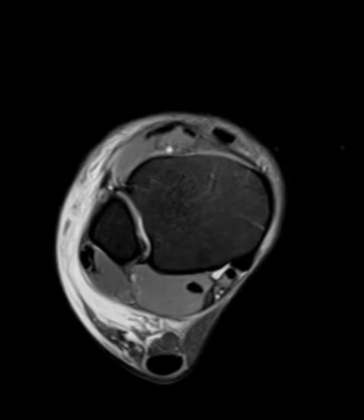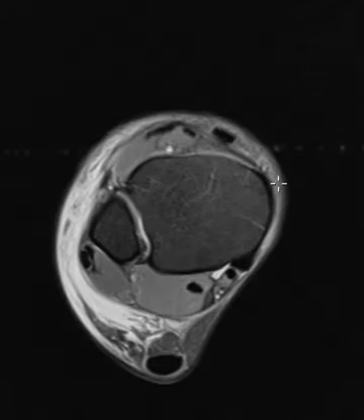Hello, this is Dr. Gay from First Second MRI, and this is a 21-year-old female with a recent injury, and she has a couple quick findings here. This is just a bread and butter basic example of an anterior talofibular ligament tear, the typical thing you'll see with a lateral ankle sprain.